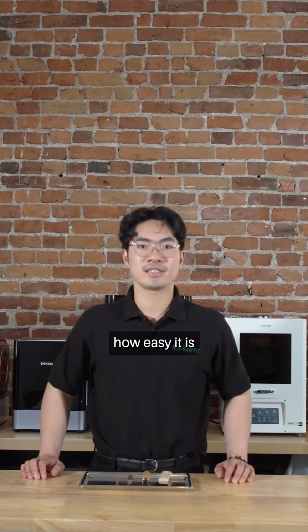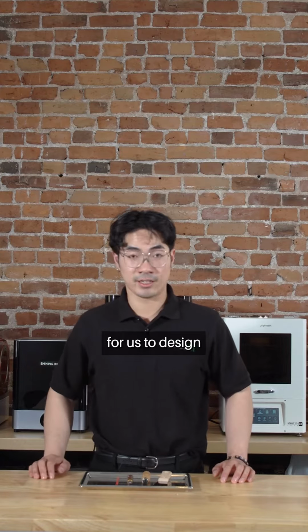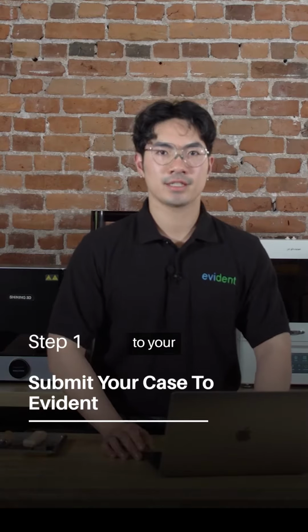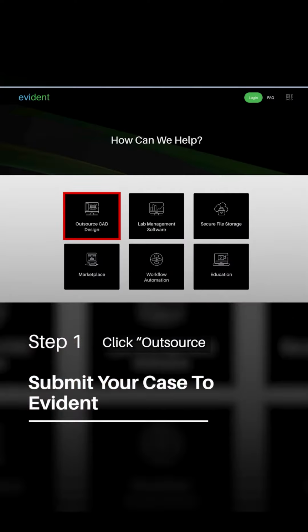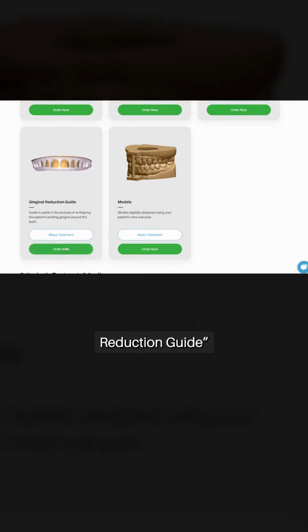Let's find out how easy it is to use Evident to streamline your workflow and upload a case for us to design. To order your design, log into your Evident account. Click Outsource CAD Designs and select Gingival Reduction Guide.